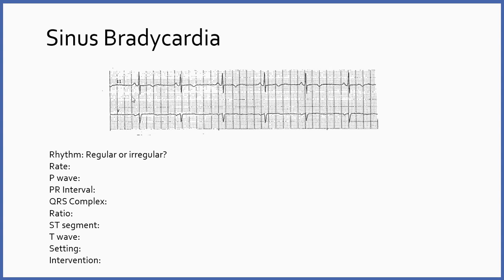Next thing we do is find the P wave. And so here's my lead 2 again. And this, by the way, is also not the way a lead 2 should look. A lead 2 should have an upright P wave. All of the QRS should be upright, and the T wave should be upright also. So a little bit of issues with this. Many of these patients were folks sitting on tele or ICU that had had heart attacks or cardiac events, and that's why we see some funky things. All right, so I've identified my P waves, and I do have a P wave in front of every QRS, and they look about the same. Remember that represents atrial depolarization.